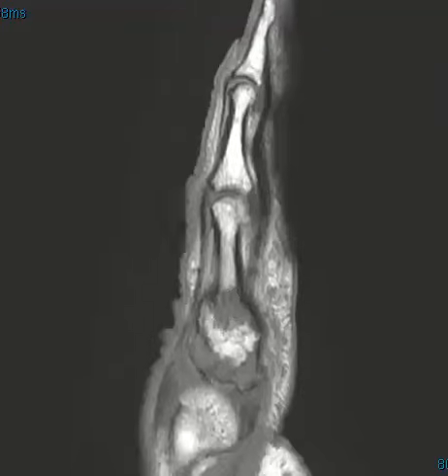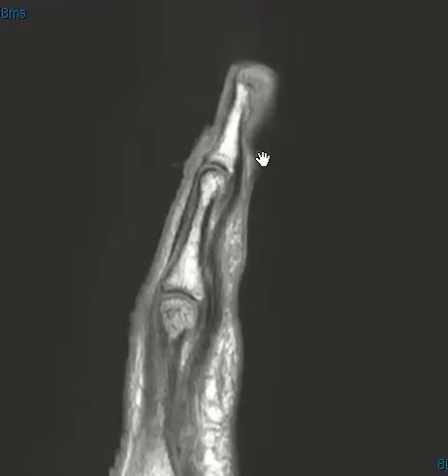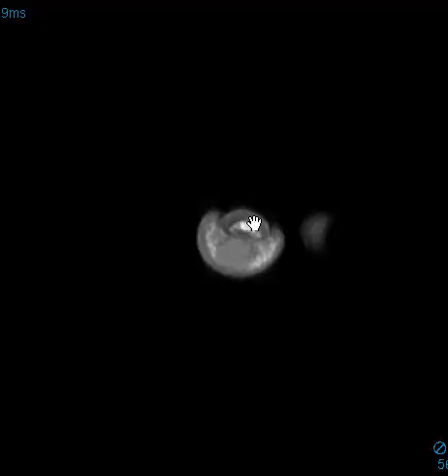Now we're going to look here distally, and on the third digit we really don't see anything on the sagittal view because interestingly that susceptibility artifact goes right across here, and they have a lesion right here. You just can't see it. But if we put up some axial images through this, we see this lesion right here. This is the distal phalanx of the middle finger, and look at this area that's homogeneous and intermediate to low T1 signal intensity. It touches the periosteum here. It's confined to the soft tissues. There's no bone erosion, no marrow edema.